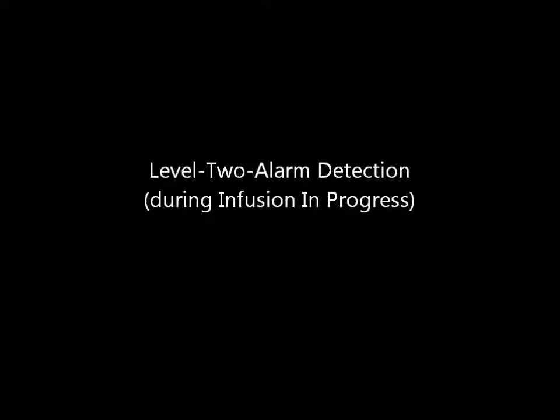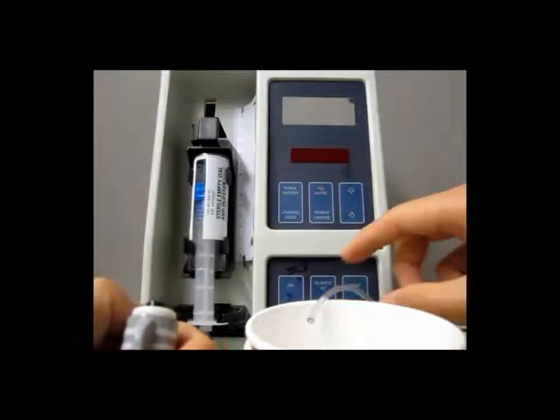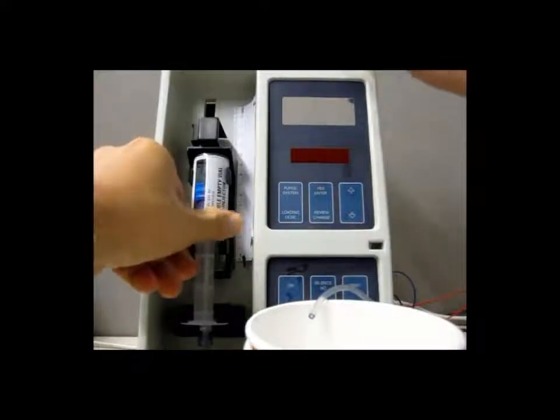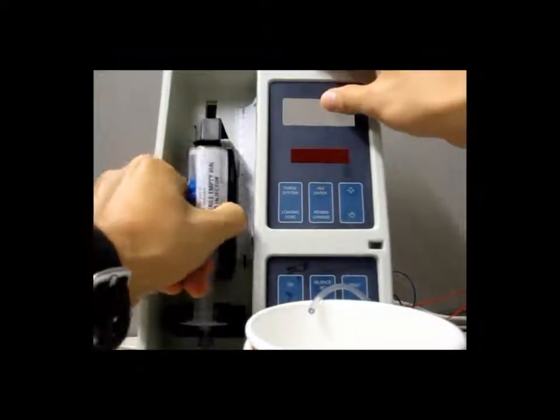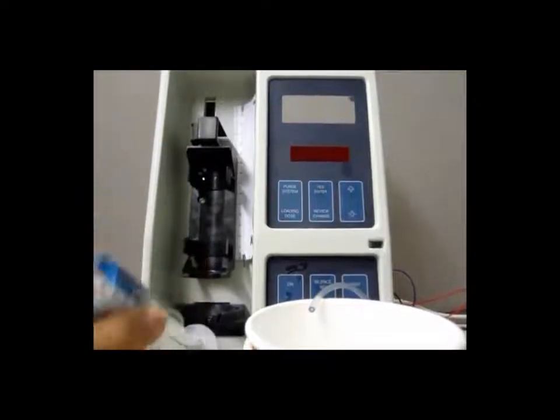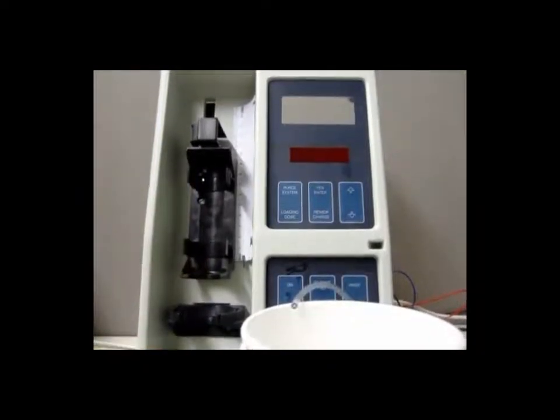Syringe-type PCA infusion pumps have a safety feature in which drug infusion is only processed when a syringe is loaded in the syringe slot correctly. Detecting the syringe-loaded condition can be done through either mechanical mechanisms or sensors.